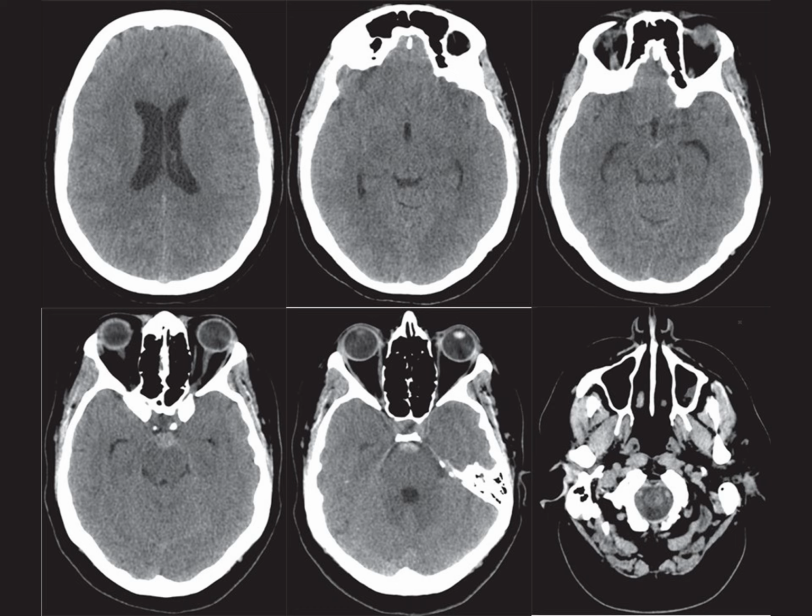In some situations, MRI with gradient echo sequences can be helpful, particularly if the presentation is delayed. However, the role of MRI in acute settings is debated. Lastly, if there's strong clinical suspicion of a subarachnoid hemorrhage and the CT scan appears normal, a lumbar puncture should be performed to confirm the diagnosis.